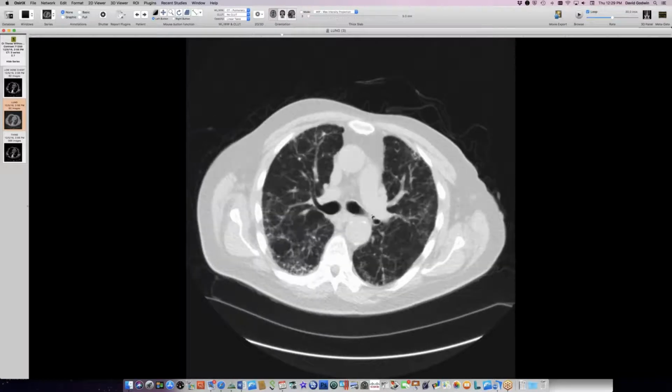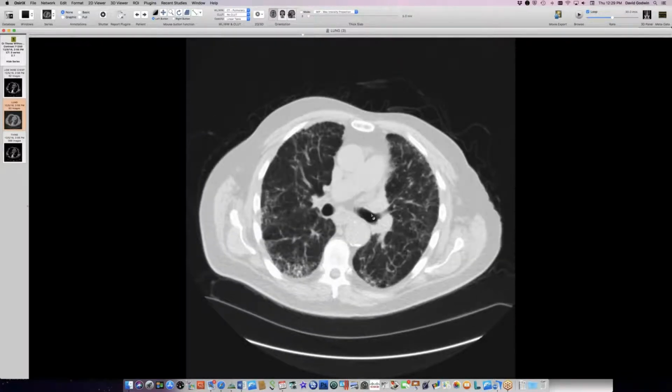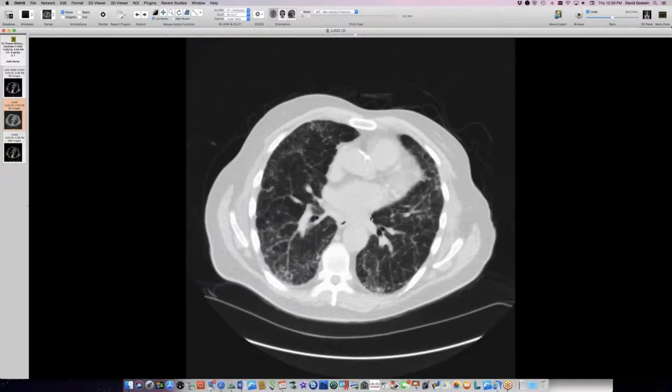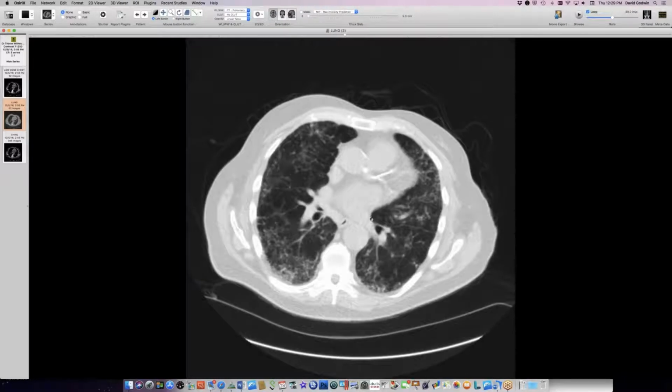So this disease has been there for years. It hasn't changed very much, and it looks most like sarcoid to me, and I think this all fits with the beryllium sensitization that he has. This is probably berylliosis. He was in a work environment where there was beryllium exposure. I think he's part of nuclear construction at nuclear sites. Okay, so I presume berylliosis in this gentleman.